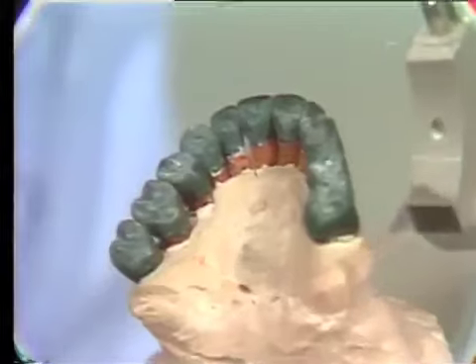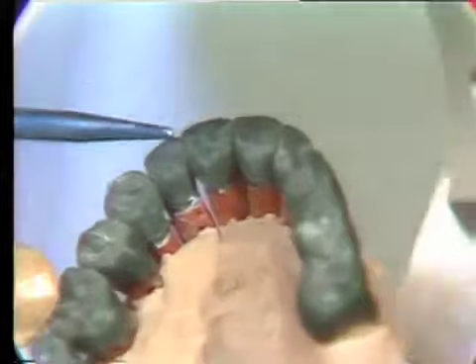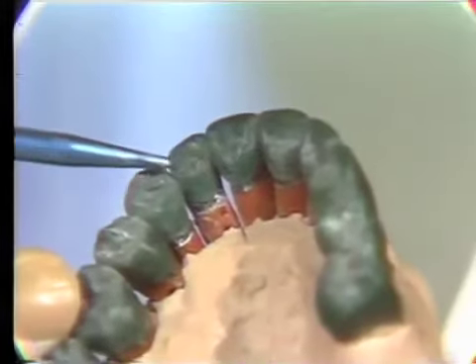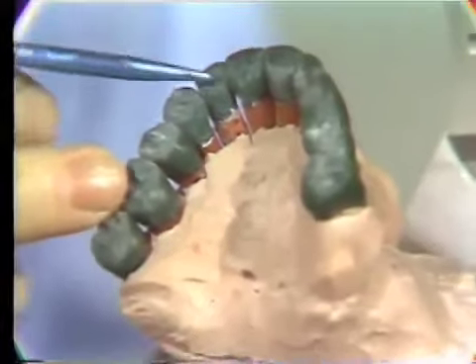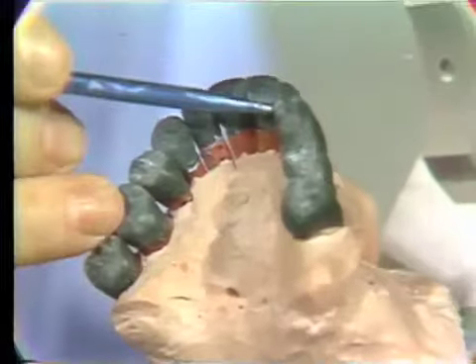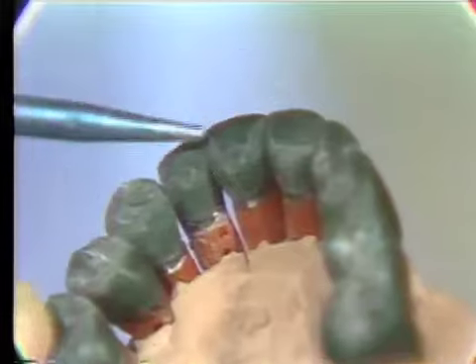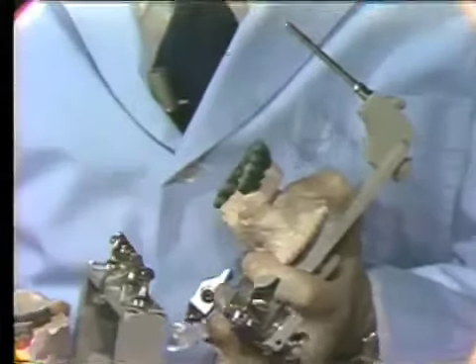Now our concern, as I said, would be mainly at these ledges on the lingual surfaces of the anterior teeth. We want definite ledges for contacts with the mandibular anterior teeth, definite centric stops. As you can see here, we have ledges or definite stops for the lower anterior teeth. And from there, we have our lingual surface of the anterior teeth to act as our guidance teeth. And these ledges are very important.